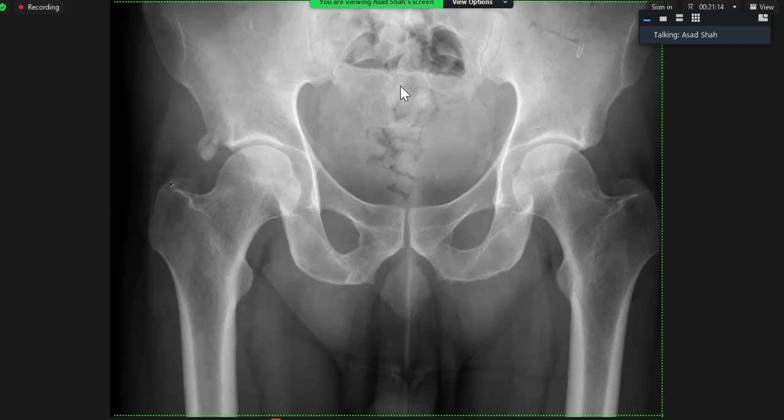It can happen here. It can happen around the trochanter. It can happen around the wrist. Commonly, we see it around the shoulder, but we can see it elsewhere as well. It's easier to comment on the X-ray than on MR. So wherever you're in trouble, get an X-ray. Thank you. All right. Great.